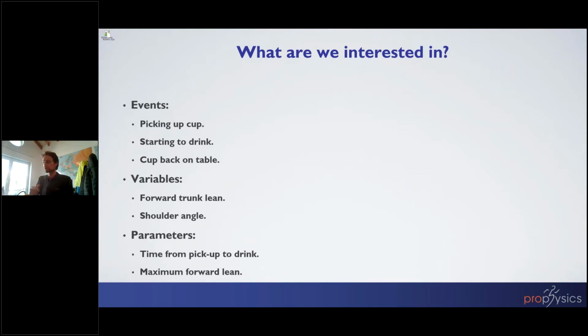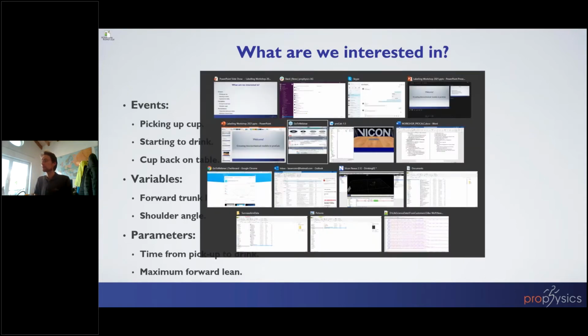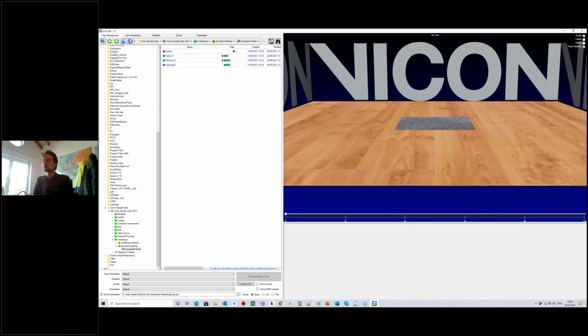So that pretty much sets the stage for what we're going to do. So then I'm going to waste no further time and get going in ProCalc.